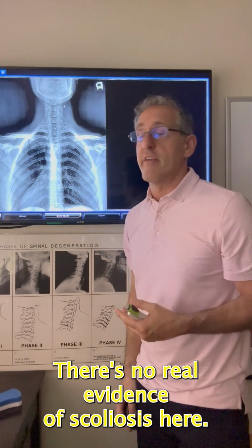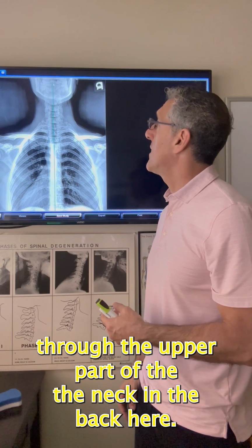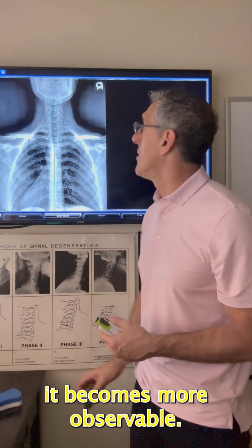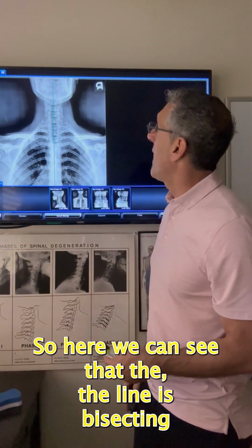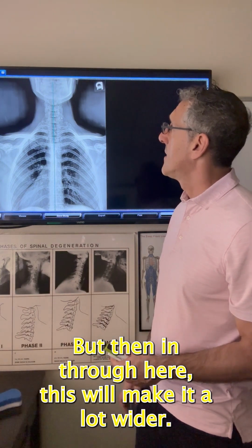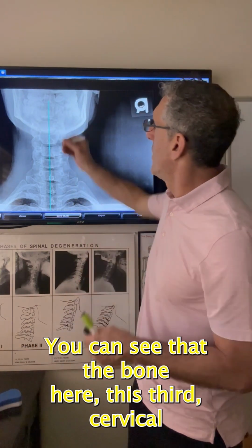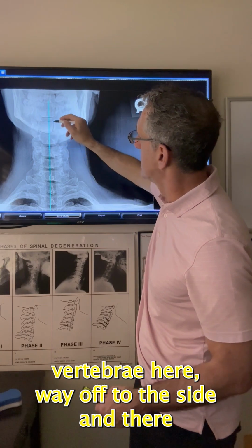There's no real evidence of scoliosis here. When we drop a plumb line that comes straight down through the upper part of the neck and the back here, it becomes more observable. So here we can see that the line is bisecting the upper part of the neck through here. We can see it's bisecting the vertebra, but then through here, I'm going to make it a lot larger. You can see that this third cervical vertebra is way off to the side in there.